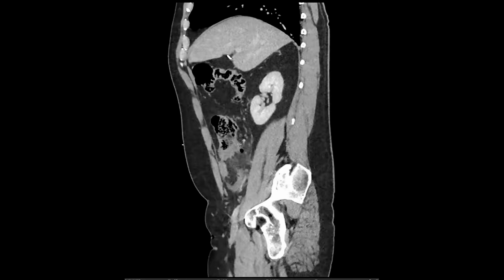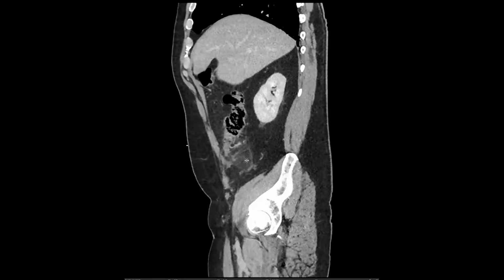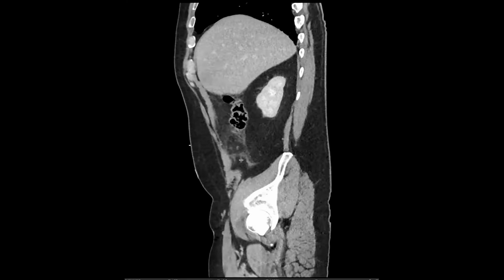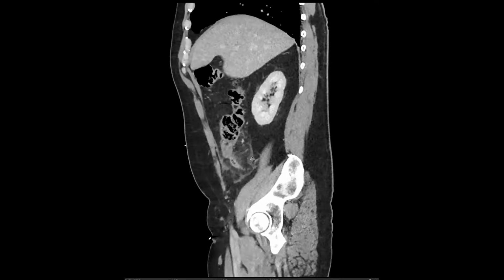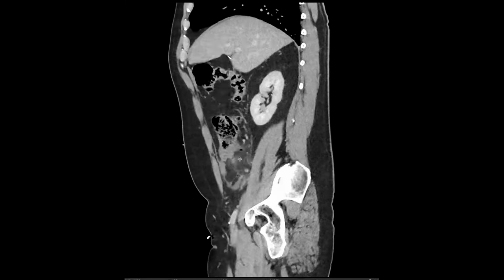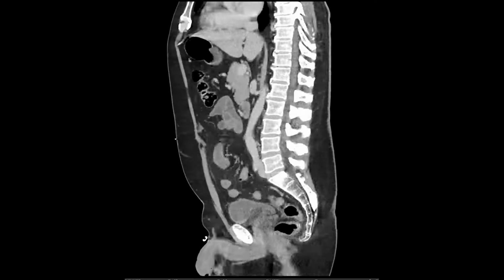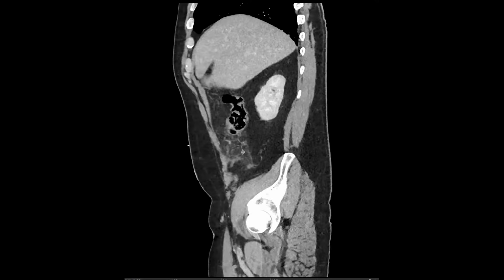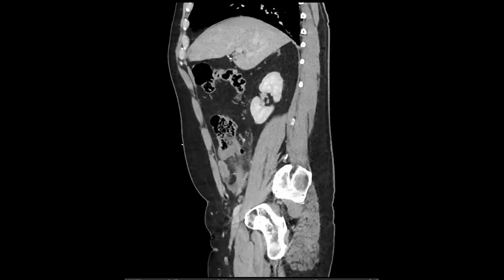And then the other thing is there's a lot of inflammatory changes here. I know, for example, differentiating a colon mass from diverticulitis, they've shown that if you have fascial thickening and stranding, it's more likely diverticulitis, in contrast to malignancy, where you typically get thickening and lymphadenopathy, and not so much reactive changes with inflammatory changes and fascial thickening surrounding it from the edema.